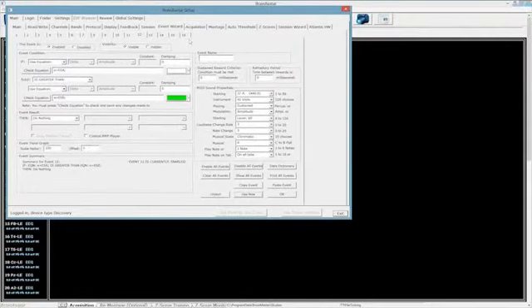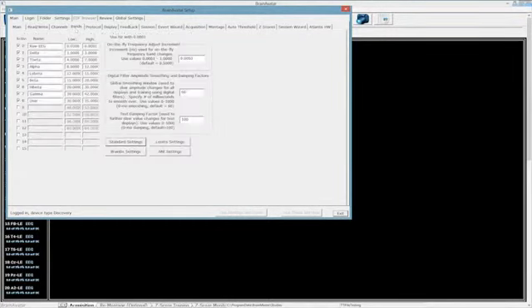All right? So here we go. We got 1, 2, 3, 4, 5, 6, 7, 8. And in the standard settings, we happen to have 1, 2, 3, 4, 5, 6, 7, 8 filtered bands.